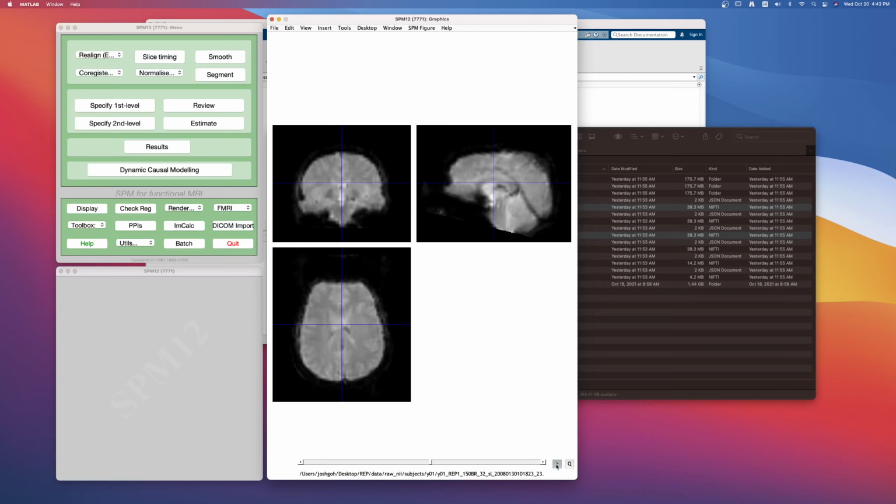The brain is more or less remaining in the same place, but all the voxels that you can see are sort of vibrating or fluctuating in their spaces. And that is the nature of the MR signal, all right, for the EPI. I'm just going to play it again for you to visualize. But pay attention, if you look at this last image, this is where the last volume of this first run is. Pay attention to the sagittal view here.